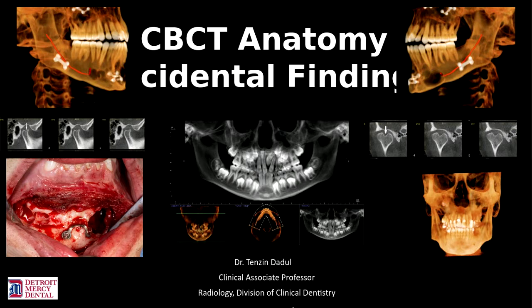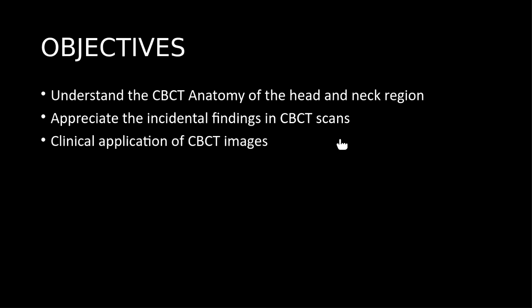Let's go forward. Today the objective is to understand the CBCT anatomy of the head and neck region and to appreciate the incidental findings in CBCT scans, because you're legally and morally responsible for all your CBCT scans. We will also check the clinical application of CBCT in dental practice. Even if you're going into residency programs or general dentistry practice, it'll be very, very useful for all the specialties.